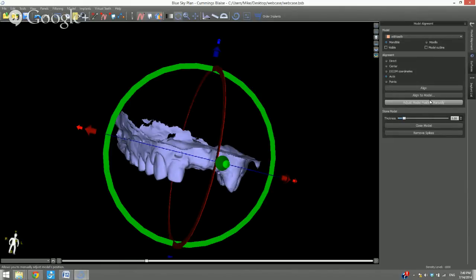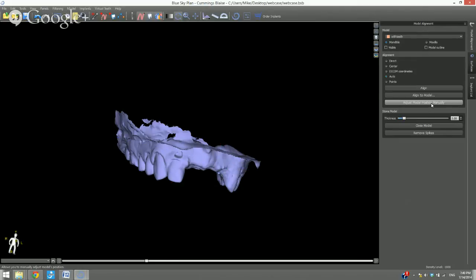manually and just rotate it so that they're generally facing the same direction. It doesn't have to be perfect, it doesn't have to be close to perfect, but just putting it in the same overall direction will help the accuracy when you go to points. If it's upside down or reversed, you just want to use the manual functionality, flip it around so that it's overall positioned facing the same direction, and then go ahead and use the point functionality.